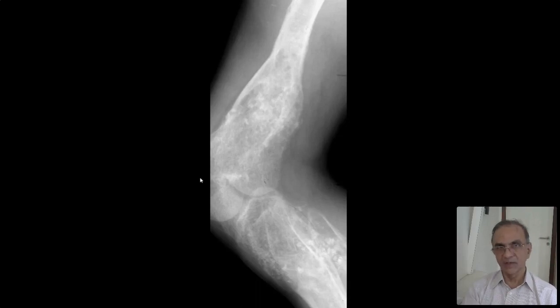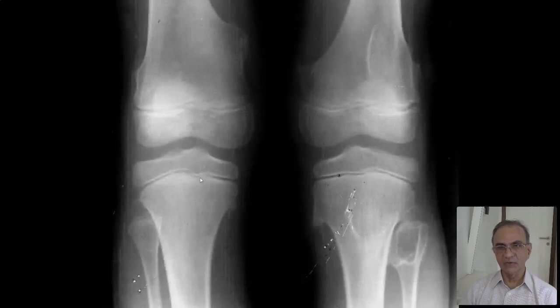It's easy to make a diagnosis. This is a spot diagnosis. Abnormal bones, calcification all over in the metaphysis, close your eyes, enchondromatosis. There are many examples of spot diagnosis, though this is not very common. I must grant that this is not common, but when seen, this is diagnostic.